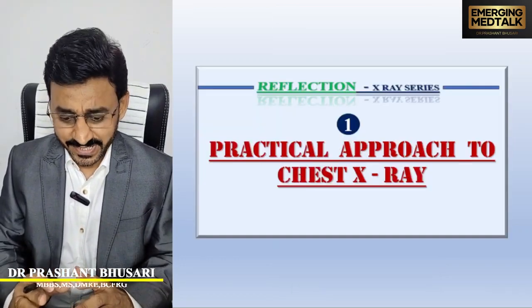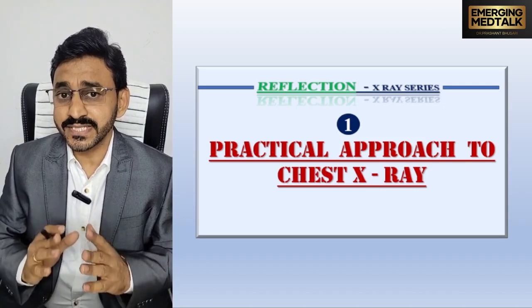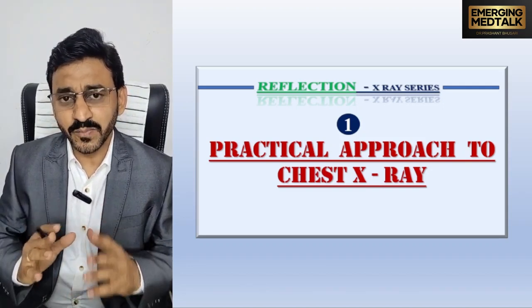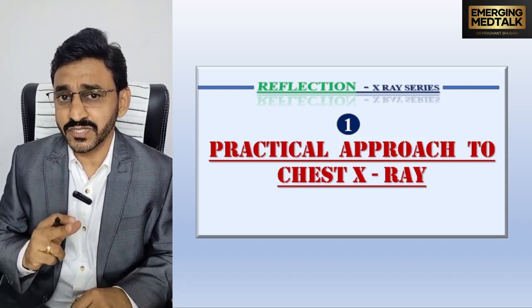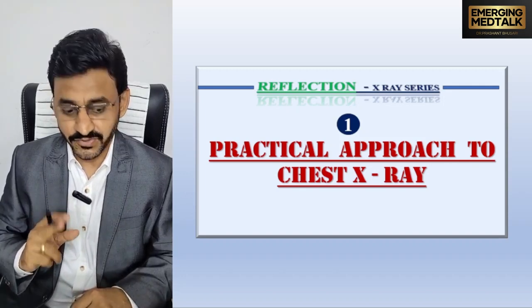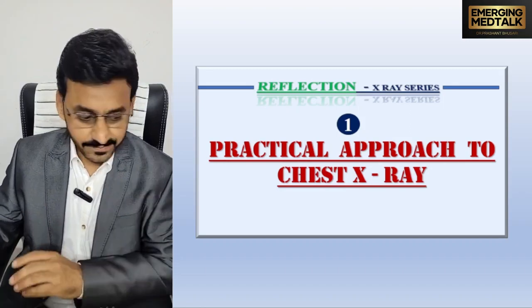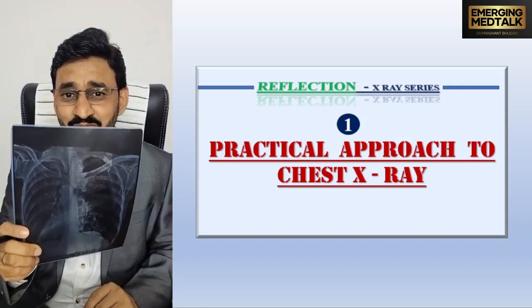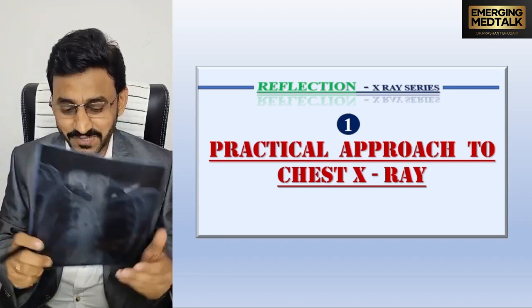The topic of discussion is the practical approach to chest X-ray, that is chest radiograph, and how the anatomical landmarks reflect on the chest. We will discuss step by step. So this is the chest X-ray. We'll discuss the practical approach now.